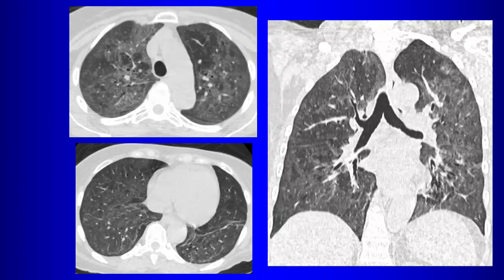So what do we have on the CT? Is CT normal? Bilateral ground glass opacities. Yeah, so we have these patchy bilateral ground glass opacities. So what's the differential? What could this represent? So we could have atypical pneumonia from what? Well, COVID, right? Something that we went through. COVID, viral pneumonias, sure.